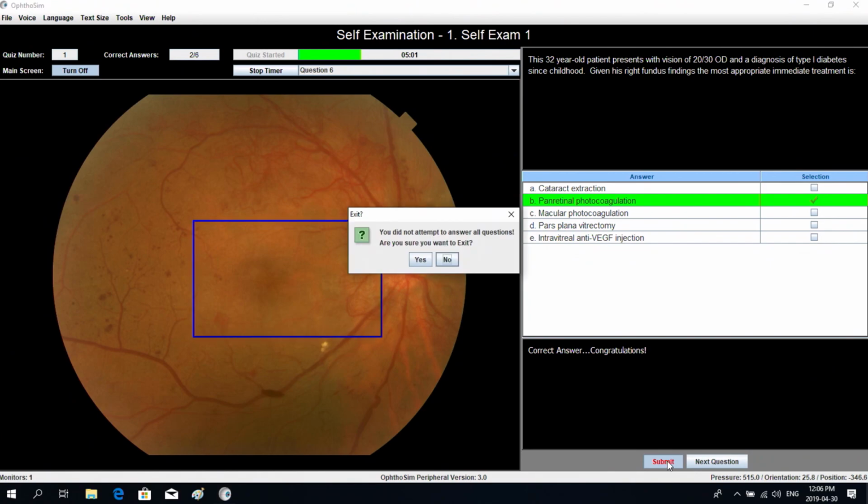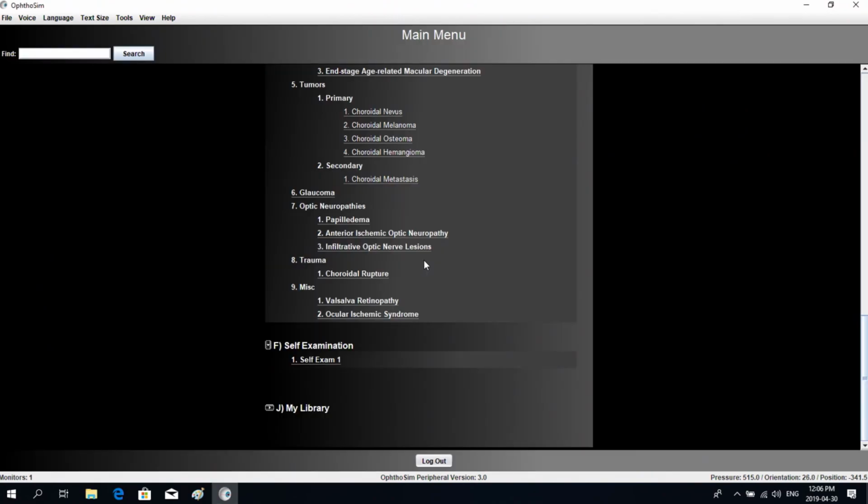And then when you're done, you submit your answer, but it gives you an error that you didn't submit all the questions. Do you want to still exit? In this case, we'll say yes, and we're done. Okay, so that's a tour of that part.